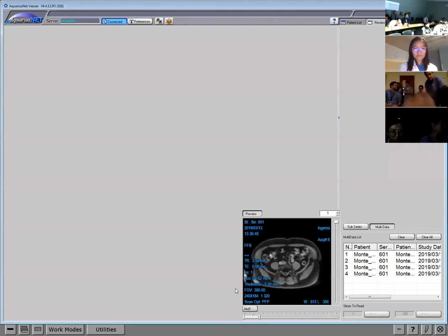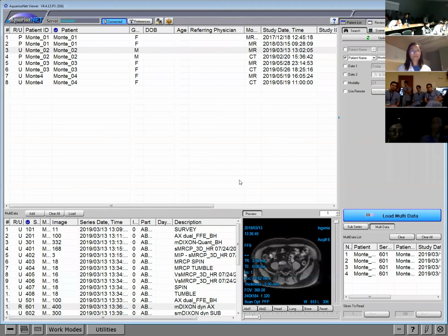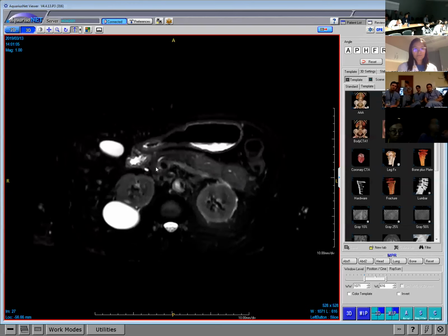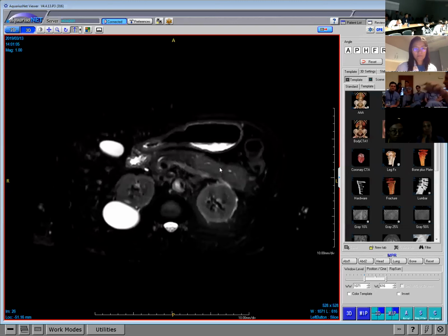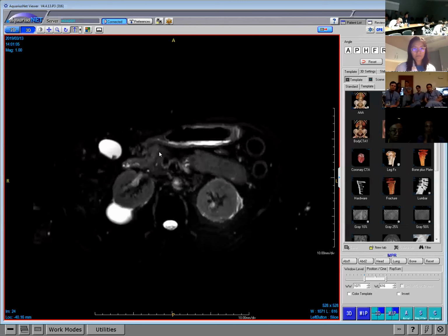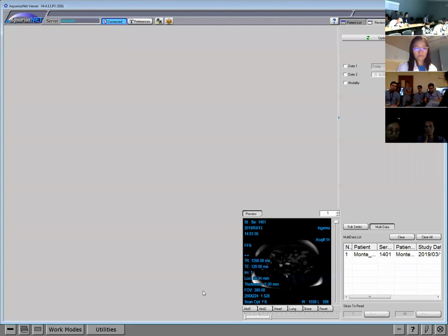You can see that there's a slight intermediate, almost edematous appearance, right? And you can see that the pancreatic duct is normal in the head and neck. And then it just kind of disappears here, maybe a little bit here. It's actually narrowed instead of dilated. And the other area looks in exactly the same way. This is a very classic appearance.